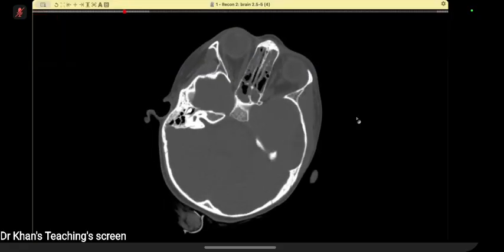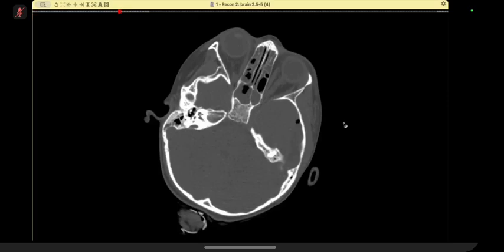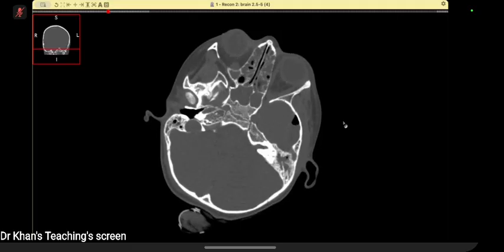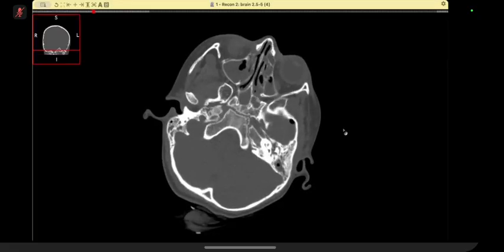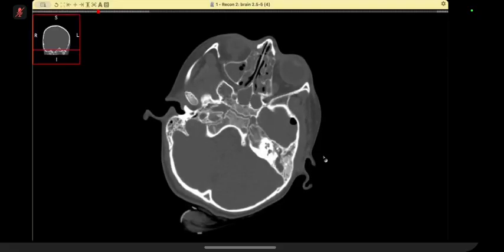So I've presented with a bone window, plain CT without contrast, showing the temporal bone. I have opacified paranasal sinuses, both maxillary and ethmoidal air cells, and also there are air locules in the anterior temporal space, intracranial, and there is another soft tissue at the aditus and antrum.